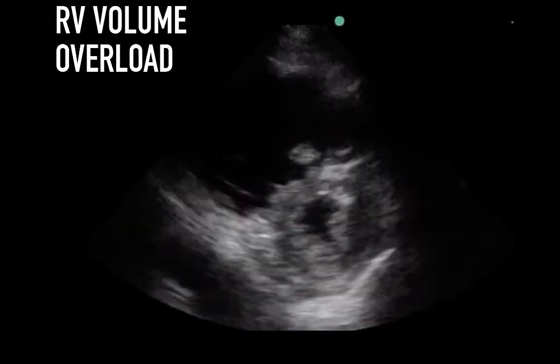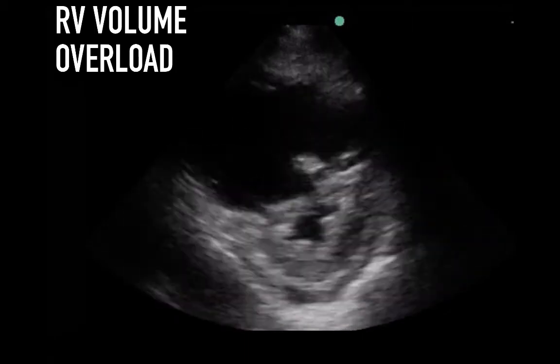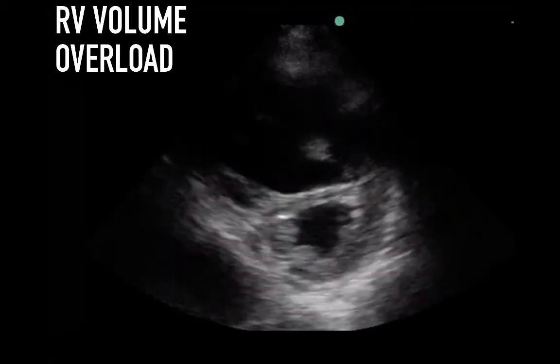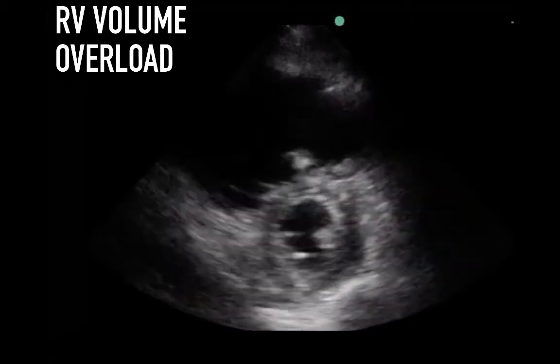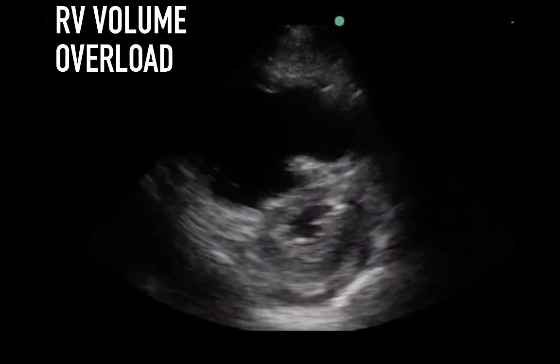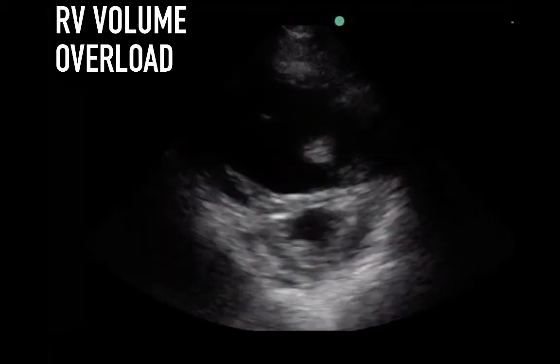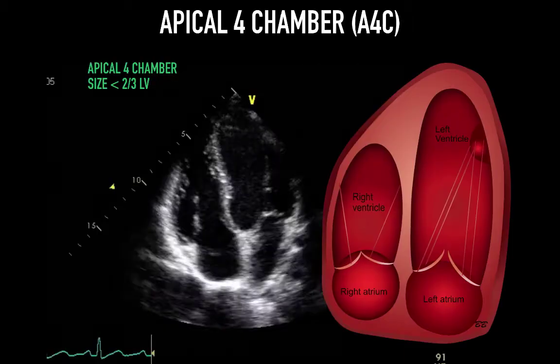You can see in volume overload, the septum flattens in diastole, but pops open in systole. This can be easier to see with an ECG tracing and really slowing down an echo loop. I will say not to get too fixated on this, as other elements of the 2D image can be equally as instructive. Moving on to RV size.